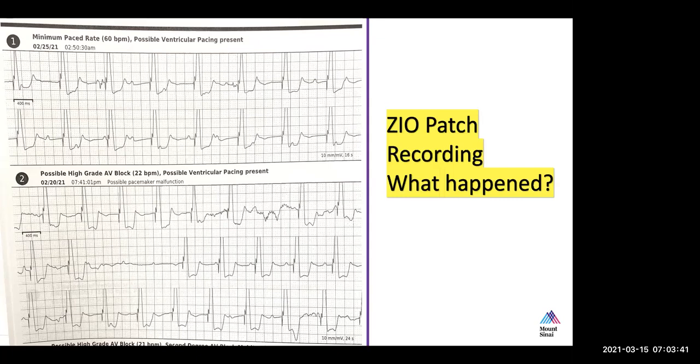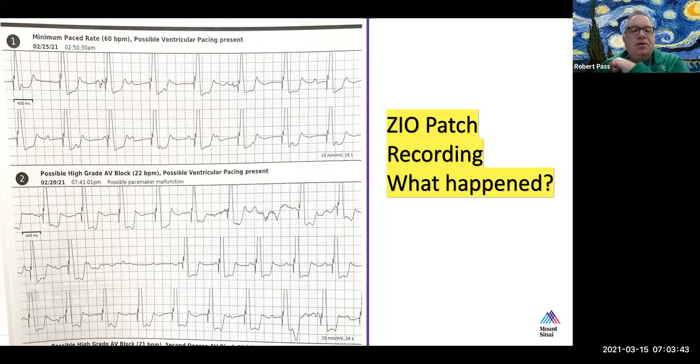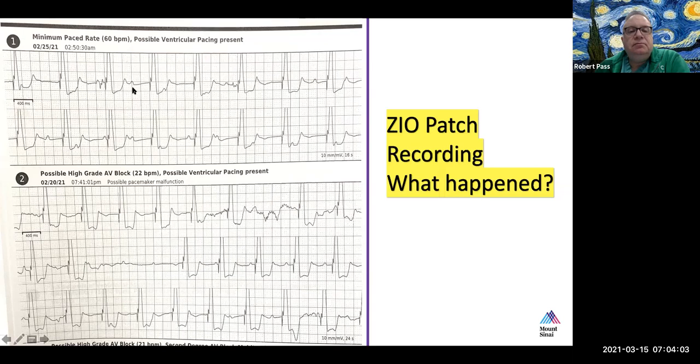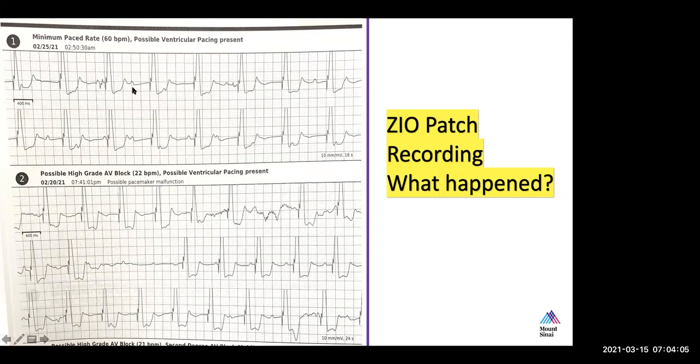Well, what kind of pacemaker do you think this is? Is this a single chamber? So I agree there's ventricular pacing. So is this a dual chamber pacemaker or a single chamber pacemaker, do you think? I think it could be a single chamber with just a ventricular lead. Why? When the atrial rhythm starts coming in, I'm wondering if it's picking up, sensing it abnormally as a ventricular rhythm that it wouldn't have if there was an atrial lead.